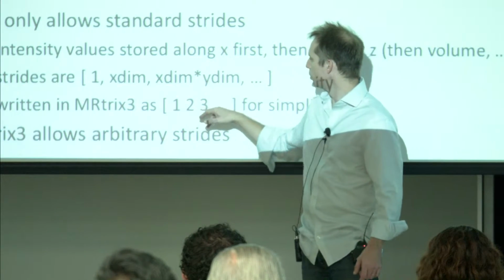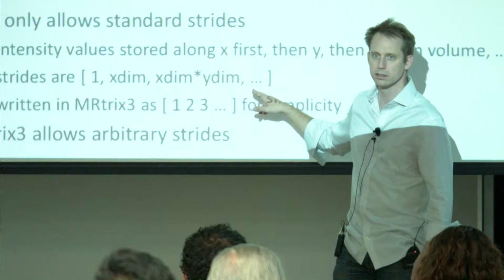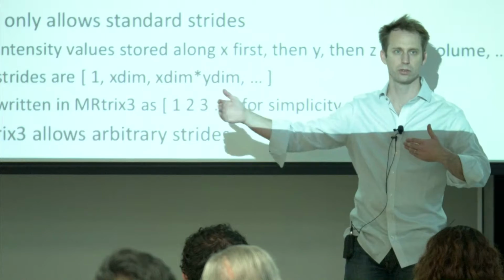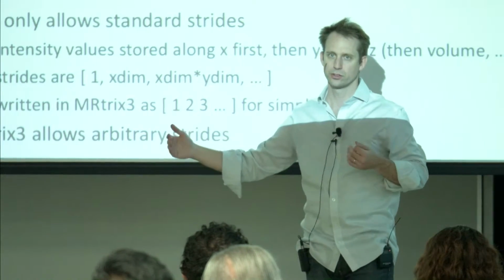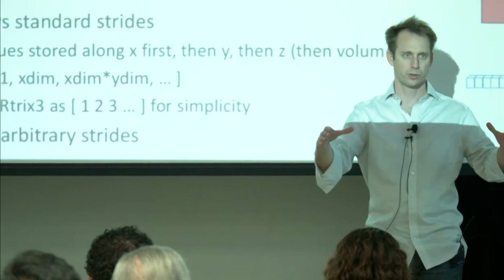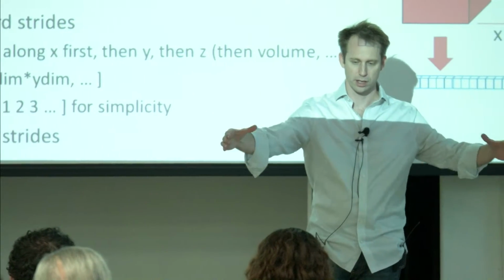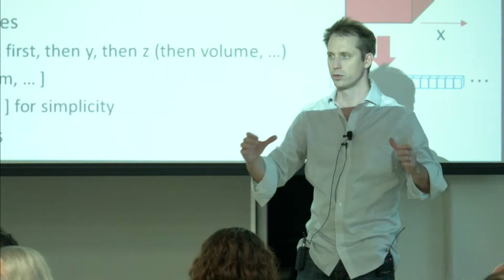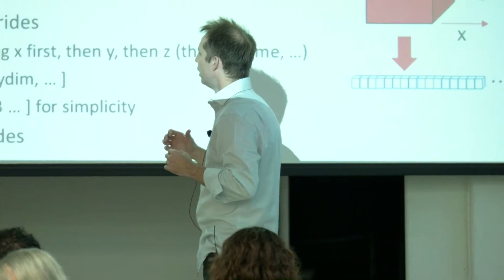So for example, I could put the last axis as 1 here, and I could put 2, 3, 4, 1, and that would be volume contiguous storage. That's useful for high performance processing, when you want to keep everything together. You process a voxel all as one chunk of data. If it's all there in the RAM, it's very easy for the hardware to optimize access to it.